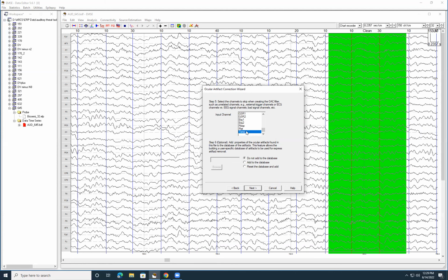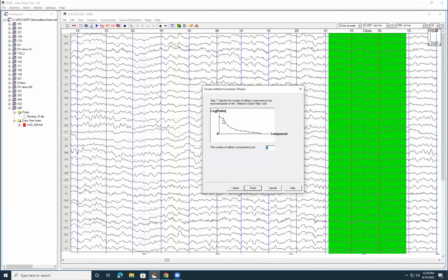Surprised it has all these extra channels for some reason. That's really odd. Shouldn't have those. These are okay to leave in. These are the eye channels. You can also take them out. Doesn't make a difference. 1, 2, 3. Yeah, let's go 4.